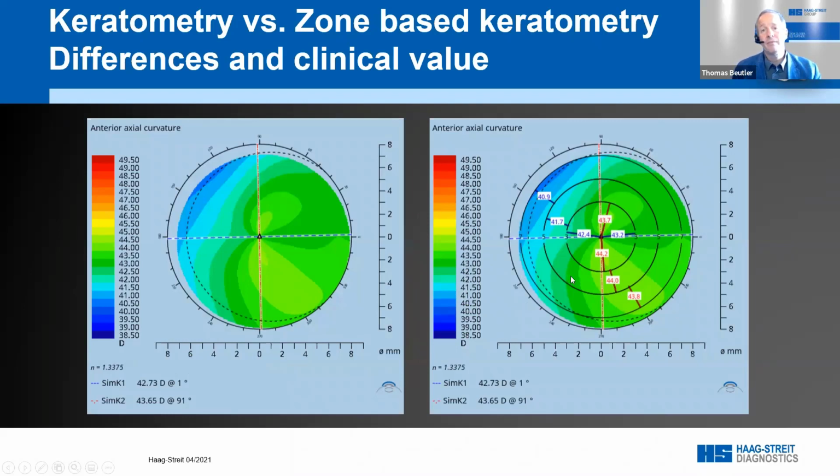So here we can definitely see that if we would still opt for a toric here, that at night vision, there will be some limitations due to the fact that we do have not a perfectly nice astigmatism. We have some asymmetry from superior to inferior, and we also see that the whole thing is bent slightly. This example we will use also later on in the Zernike analysis to have a little closer look on what we get from there.